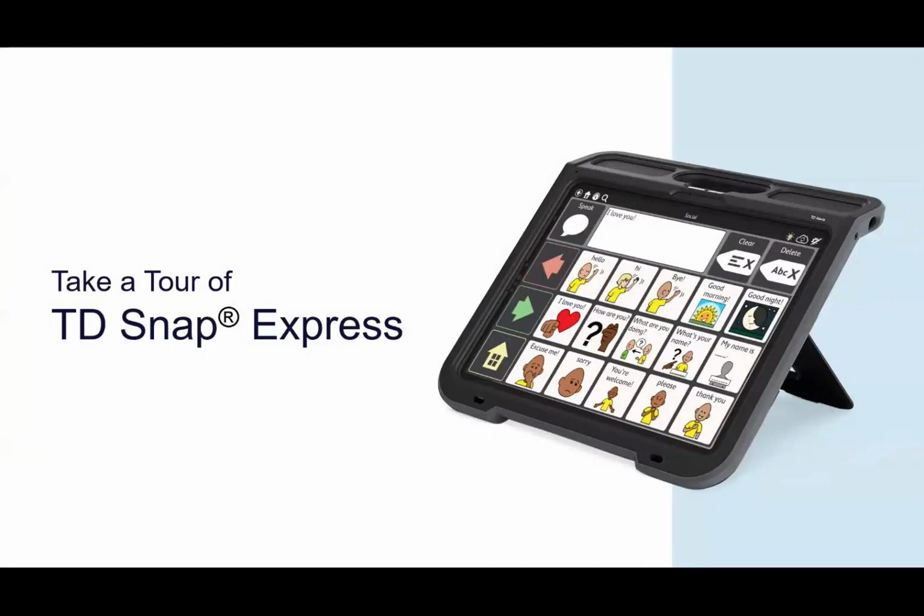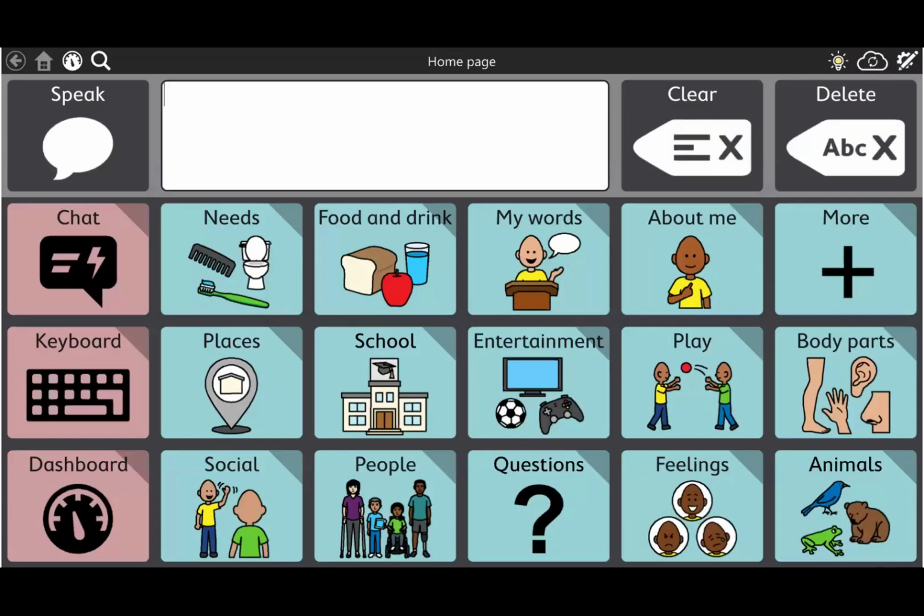All right, so now kind of keep those communicators in the back of your mind. Let's take a look at how this page set would work for them, looking at just basic organization and layout. So TD Snap Express features an 18 position grid size that's broken up into different themes.